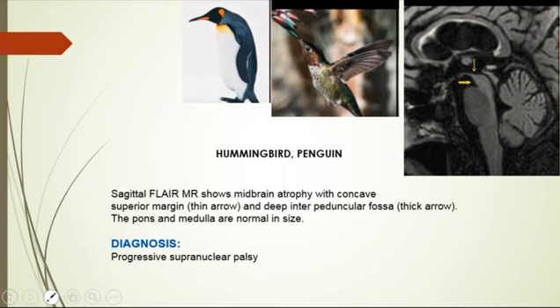On the sagittal images, you can see the hummingbird sign referring to the midbrain atrophy with normal pons and medulla. On axial images, the Mickey Mouse or the morning glory sign is produced by midbrain atrophy with preserved cerebral peduncles. Focal hypometabolism on the PET, decreased metabolism due to atrophy, gives rise to what's called the pimple sign. Findings may be difficult to distinguish from age-related volume loss and other dementia disorders. Like all neurodegenerative disorders, the clinical picture is very important for narrowing the differential diagnosis. Okay?